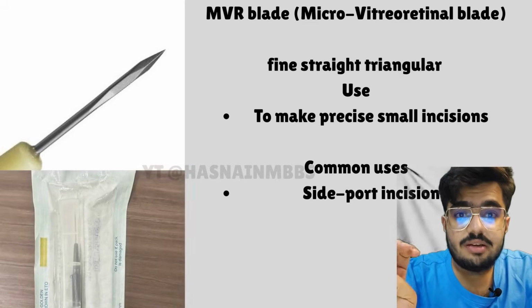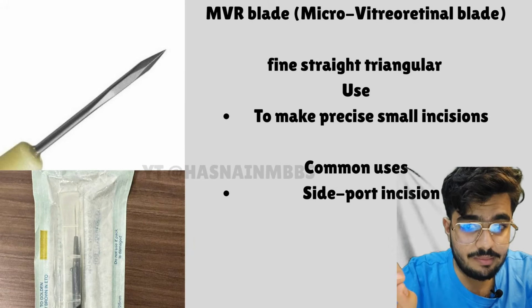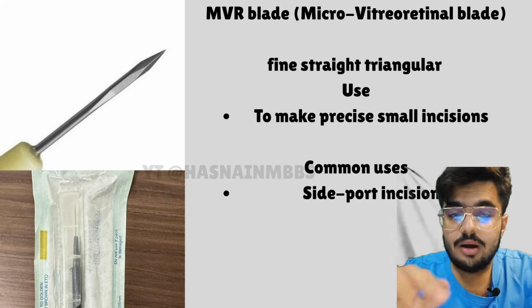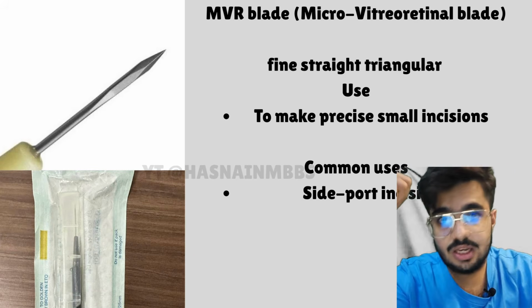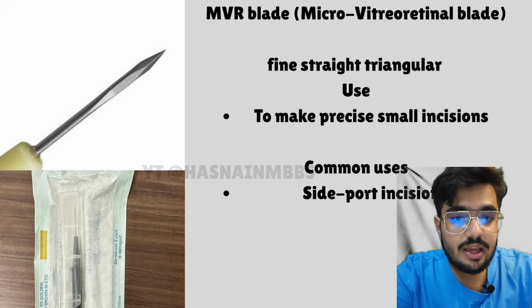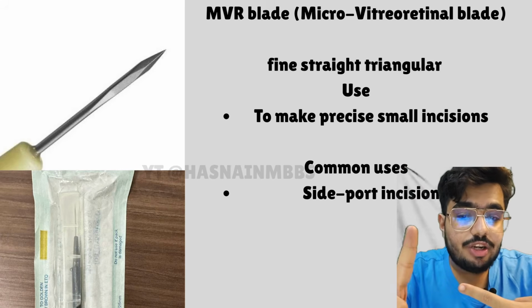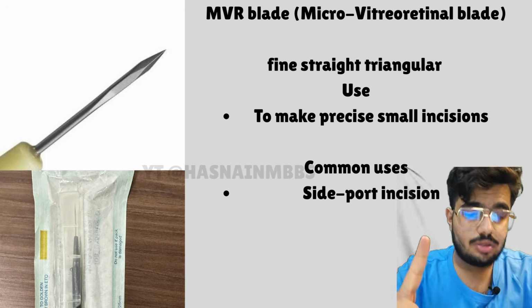Last but not least is our MVR blade. MVR stands for microvitreoretinal blade. All the three earlier had angulation, 15-degree, 45-degree, or different angulation. But the MVR blade will be straight. It will be triangular. It is used for making the side port incision.